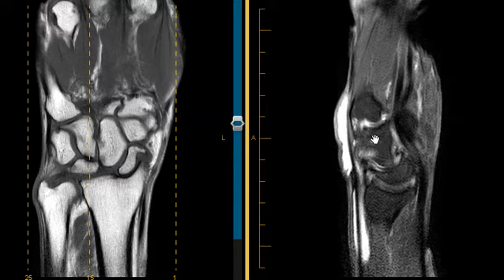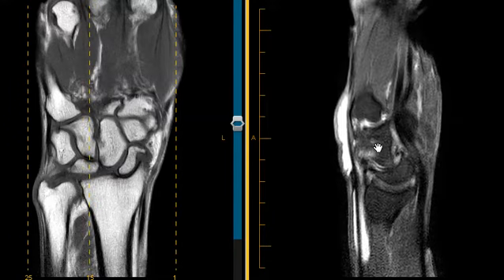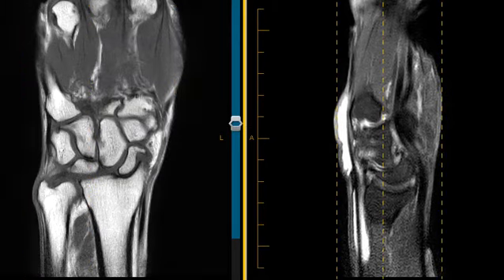It'll tilt backwards and this capitate bone can become abnormally positioned like it is now. It's not sitting right in the middle, it's backwards. So this is a severe problem with the ligamentous instability, where the bones are getting out of alignment. And this is also associated with something we see better on this.